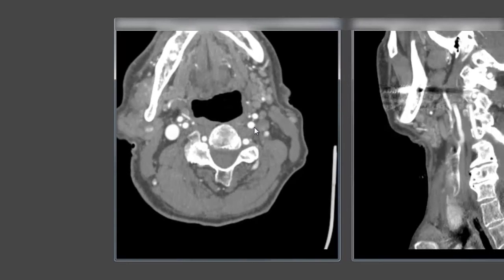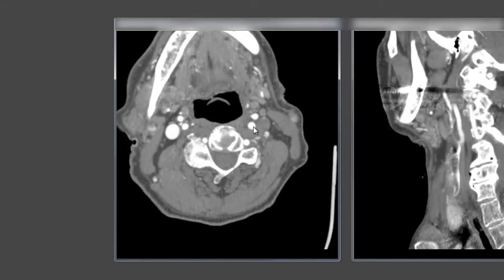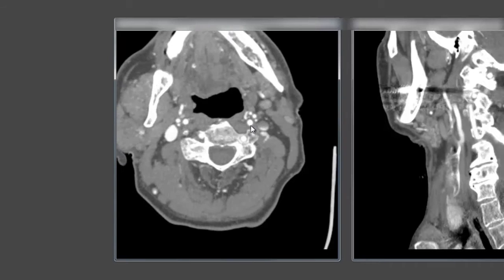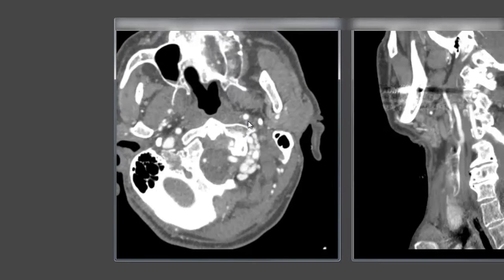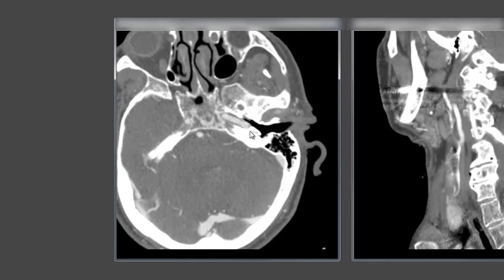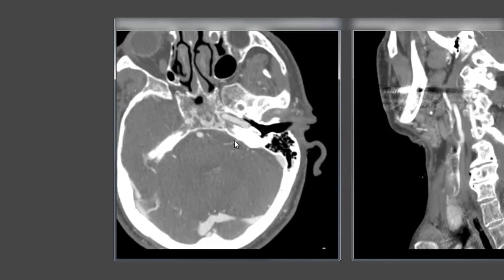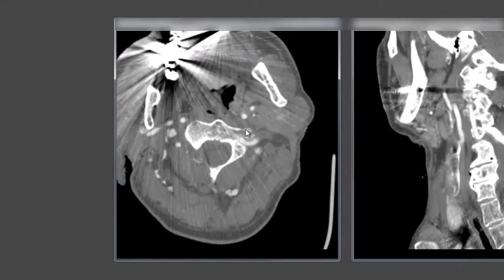As we come up, immediately we can see that this vessel is branching, so that must be our external, as the internal carotid doesn't have any branches between the carotid bifurcation in the neck at its origin and the skull base. So we follow our internal up here, again looking at the same thing we looked at on the reconstructions, all the way up to the skull base, and then we can window it so we can better silhouette against bone, and we can see it, we're all the way up to that petrous portion, and we've already tracked it up from there.